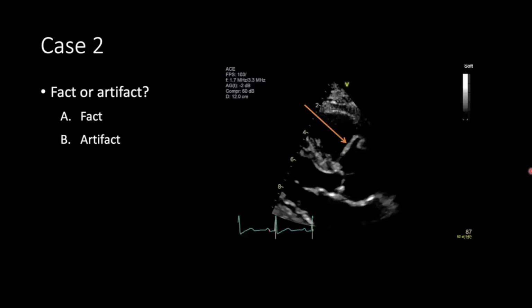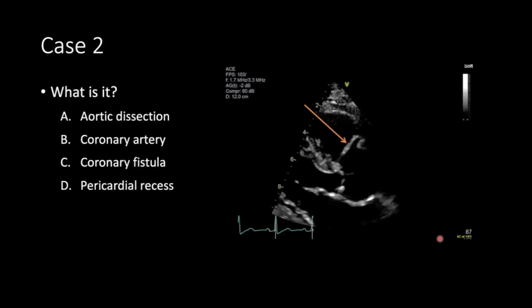Show of hands here. Who thinks it's a fact, and who thinks it's an artifact? Okay. Most people think it's a real finding. I need more views. Could be. Yeah, unfortunately, I don't give you more views. But that is a realistic answer, that you would want to look at it in more views. You can always use more views.